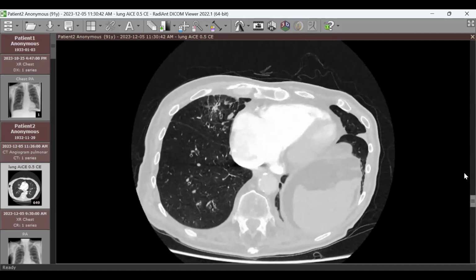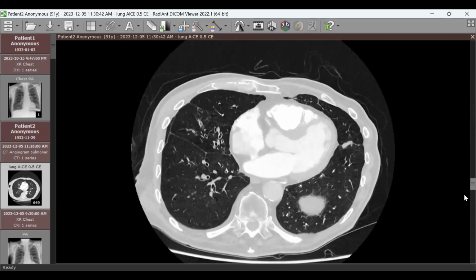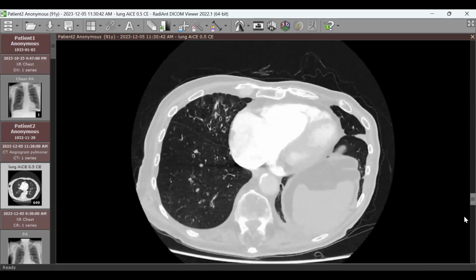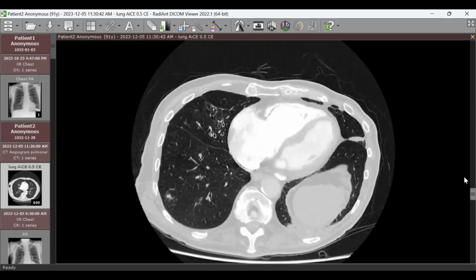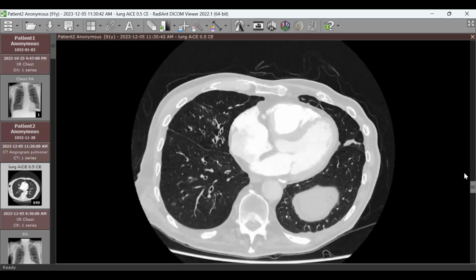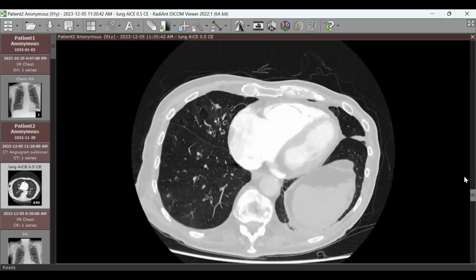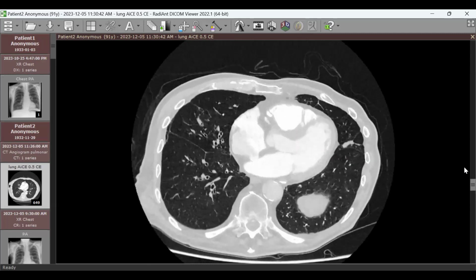Sorry, doctor. There is a nodule also in the... Yes, well, what's your conclusion? There is a bronchiectasis. You mean a unifying diagnosis? Sorry, I couldn't hear you. Can you hear me?